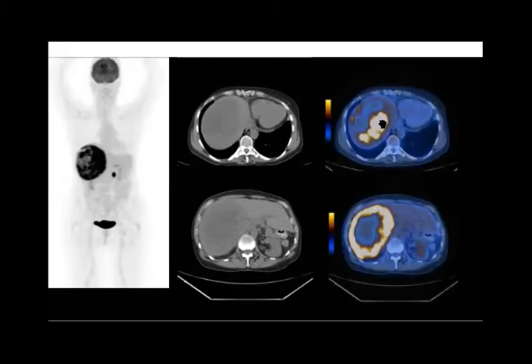So yeah, but I will just tell you something. The abscess, you know that the wall of the abscess is thin. So do you agree that the abscess is not typical to be like this? I mean, the FDG uptake, you can see soft tissue thickening here in the wall. Okay, so do you think that it could be inflammatory again, or it could be a tumor?